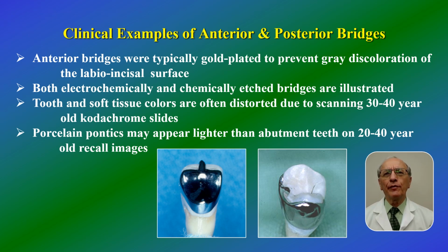For the following review of actual treatment, the following criteria apply. Anterior bridges were routinely gold-plated except for the introductory 3 or 4 years. An opaque white resin introduced by Dr. Van Thompson was routinely used. Both electrochemically and chemically etched restorations are included in this presentation.